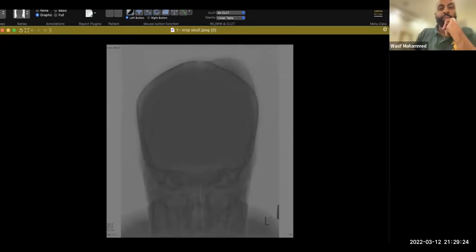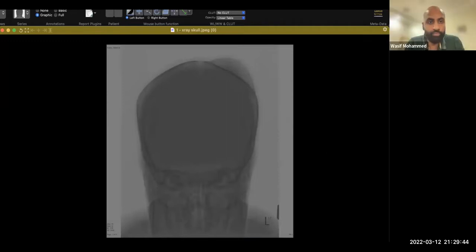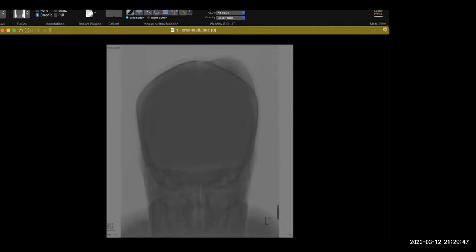Okay, I know the image is a bit weird for this case, but this patient is a 6-month-old baby whose mother felt a lump on the head. All right, so it's a 6-month-old baby. This is probably a scanogram or an inverted radiograph of the skull, whereby I could appreciate a soft tissue swelling along the left parietal area. This can be further assessed with an ultrasound. I could not appreciate any osseous break in the provided image.